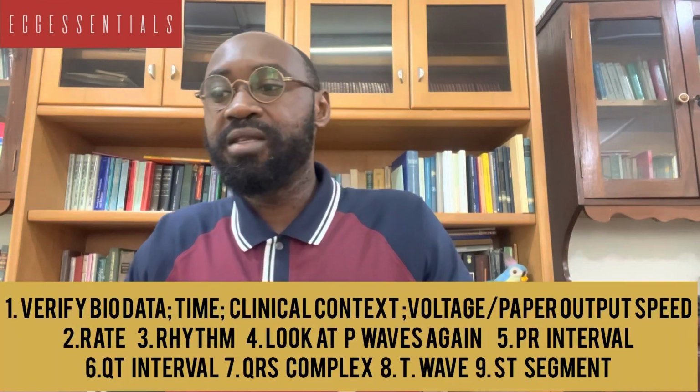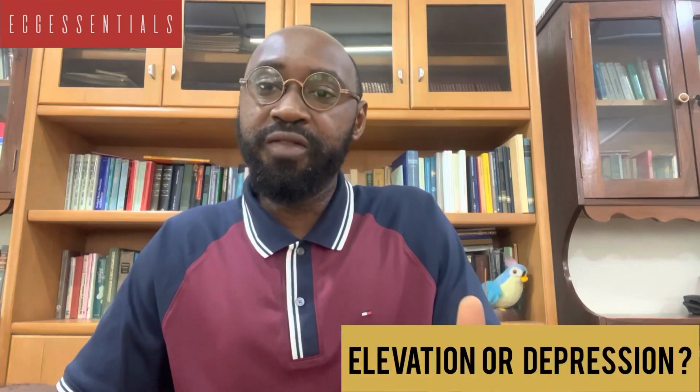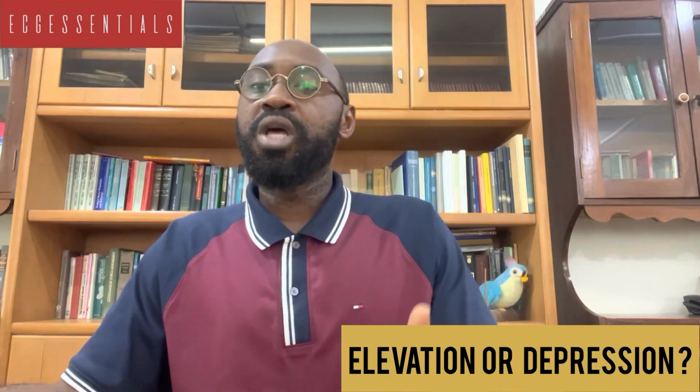With respect to ST segments, the most important focus here is whether or not there is an elevation or a depression. For ST segments, depression or elevation, we also have to pay attention to their morphology, because sometimes the ST segment may appear elevated, but if you pay attention to its morphology, you realize that it may not be a pointer to an ischemic event, or say an infarction.